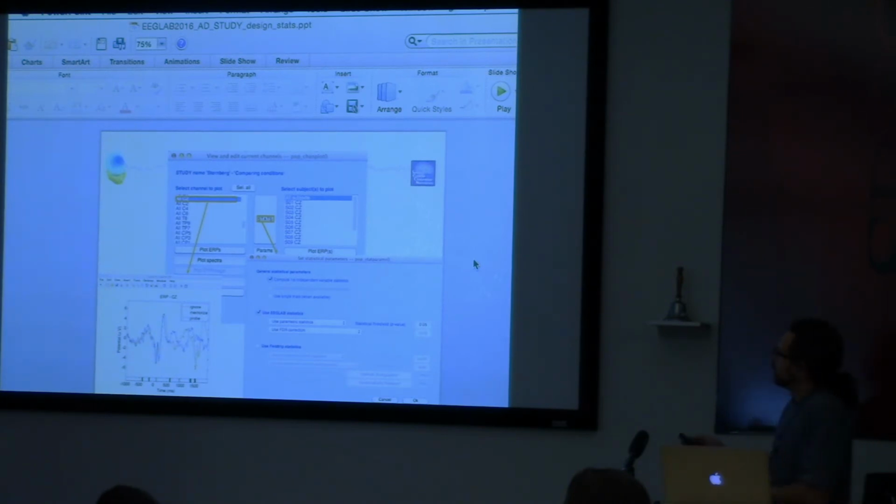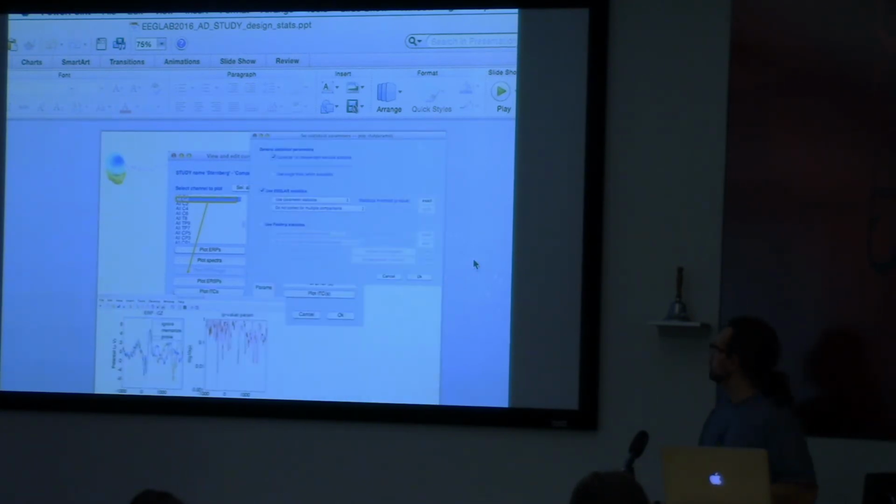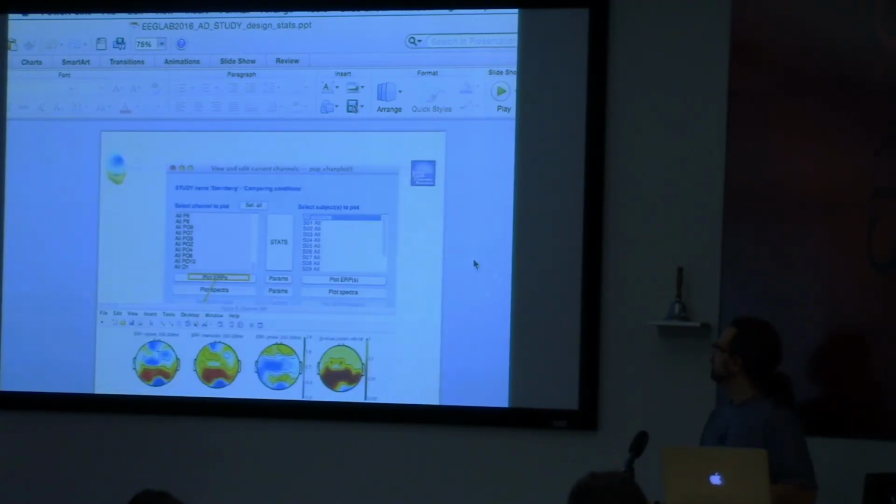So that's the example where, if you set a threshold, you go back to statistics, you set your statistical threshold, and now it allows you to plot statistics on the bottom. Okay, so now it's black bars wherever it's statistically significant. And then you can use different methods for correcting for multiple comparisons. Cyril already talked about these methods. You can also plot scalp topographies, by the way, and statistics for scalp topographies.